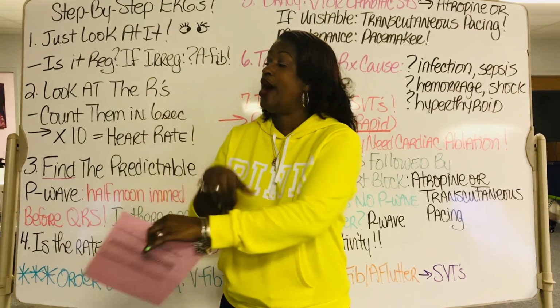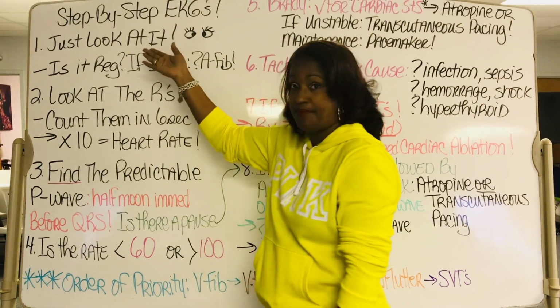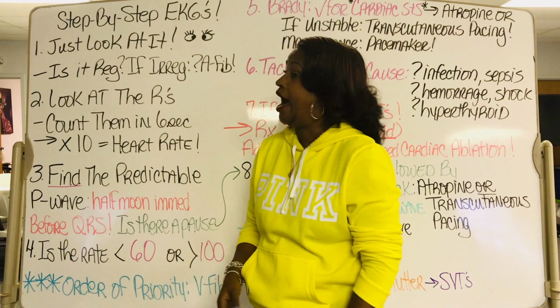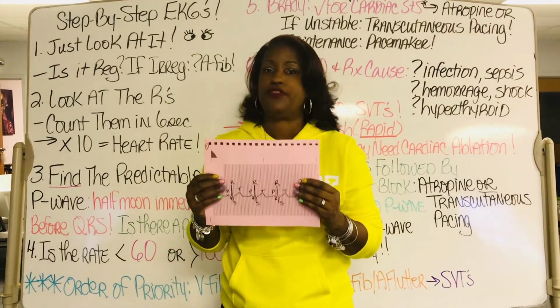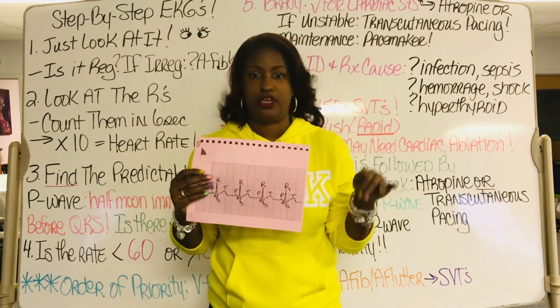All right, let's go. Step 1, basics of EKG. Take a step-by-step approach. The first step is just look at the EKG. I didn't say measure, I said just look at it. So in your page that you share with us, the NCLEX Coach page, we actually have 5 pictures.